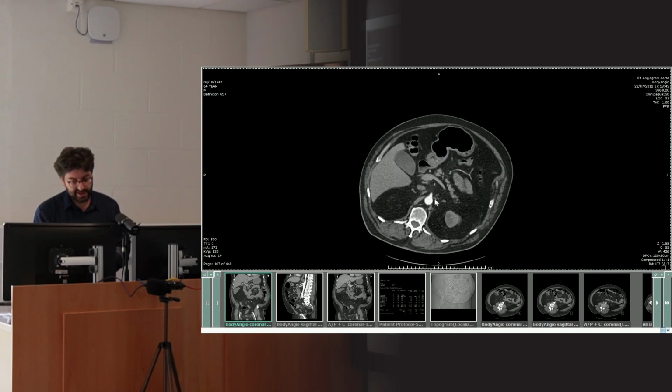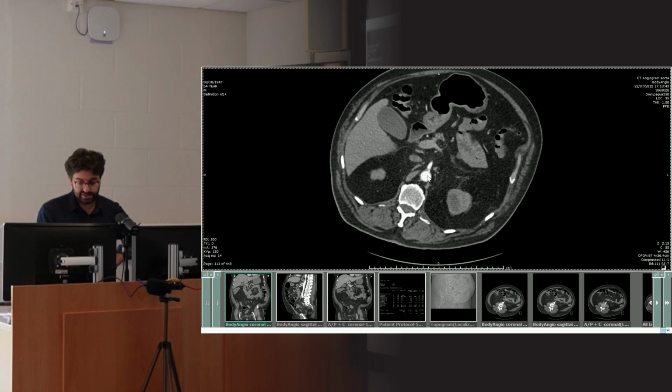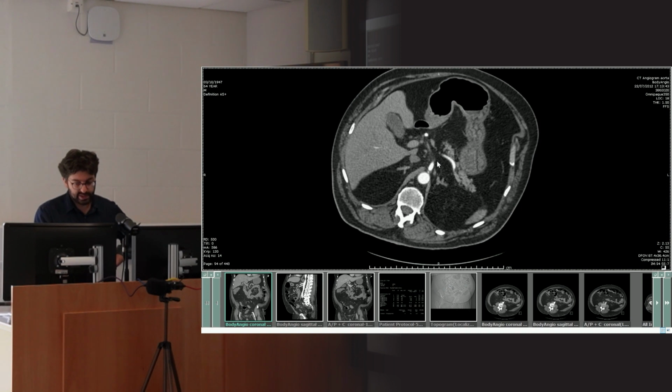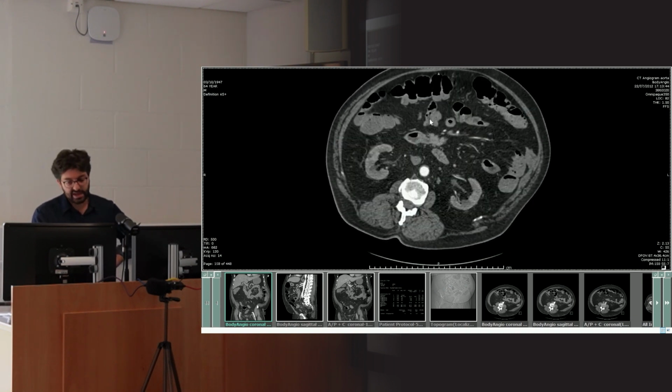And we call it an arterial phase because, unsurprisingly, the arteries are very bright. And this is roughly around 25 to 35 seconds or so after you've injected the contrast. And you can beautifully see all the vessels. So if you're worried, for example, about arterial bleeding, if you're worried about arterial ischemia, like a blocked artery, something like that, or you're worried about aneurysms and that kind of stuff, that's when you would do your scan.